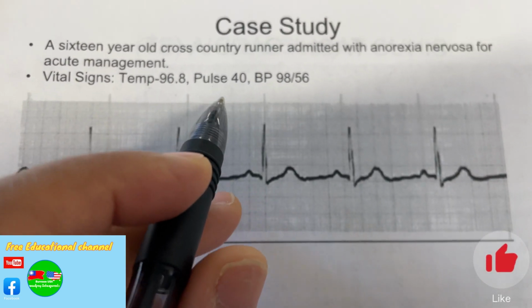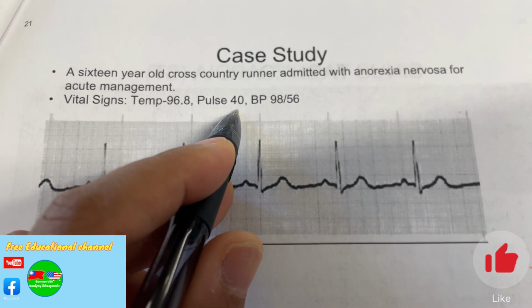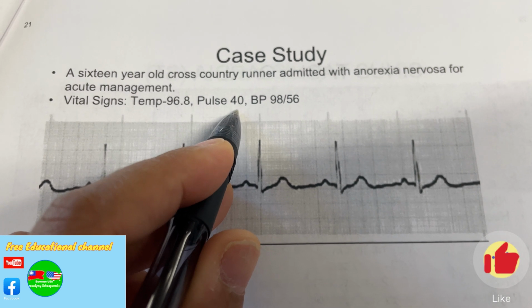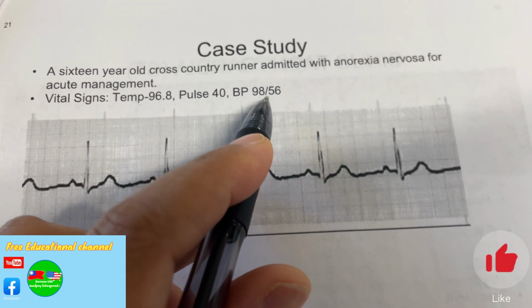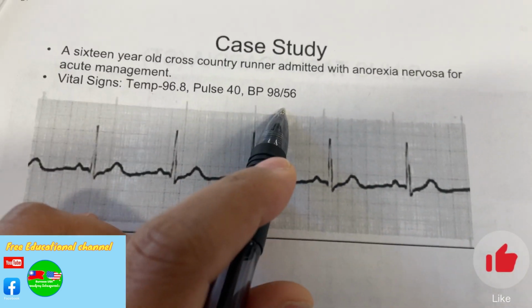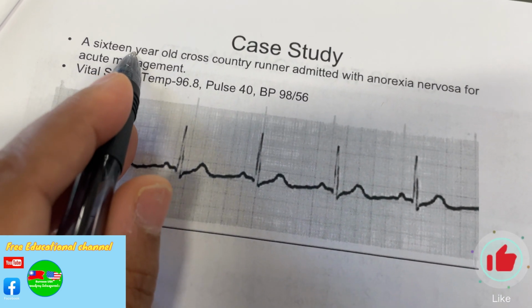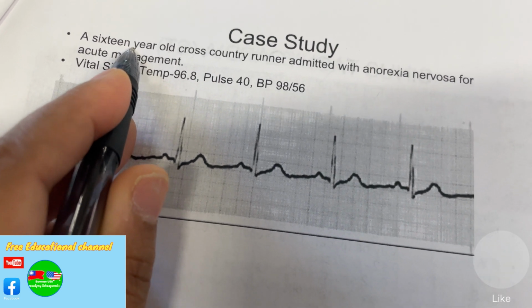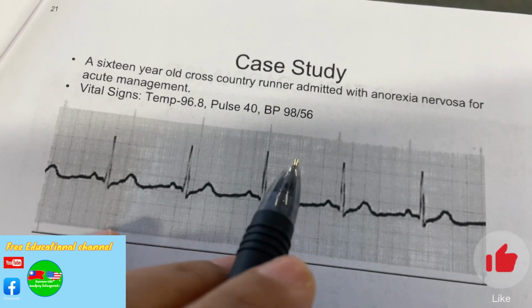And pulse rate is 40. Look at pulse rate, 40. The usual pulse rate has to be 60 to 100, right? So this is 40, kind of low, isn't it? And the blood pressure 98 over 56 is kind of on the low side, but you don't need to worry too much because she is only 16 years old and also athletic. Some people have low blood pressure.